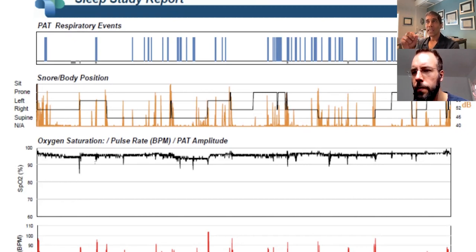And then they can cause arousal sometimes if they're severe. I've seen instances where the WatchPAT is confused by severe PLMs. So it's WatchPAT study number one. The reason why I'd want a formal overnight study is, hey, did that person have PLMs, right? And it was miscalled respiratory events because the rest of it didn't make sense.